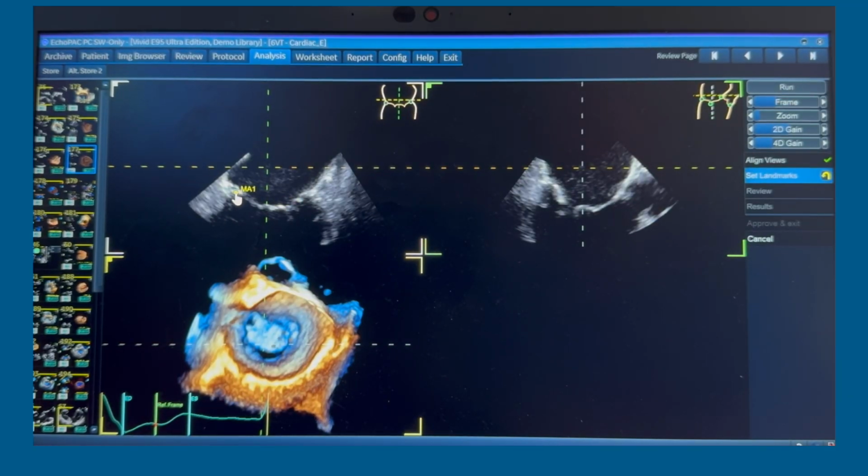There's mitral valve annulus 1, mitral valve annulus 2, then your posterior annulus, anterior part of your annulus, the coaptation plane. There's probably a coaptation gap there, but that's the coaptation plane, and that's the aortic valve.